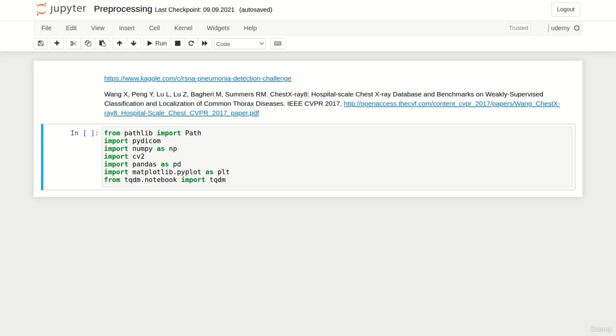Hi everybody and welcome to the first programming lecture of our Pneumonia-Classification project. In this lecture we will pre-process our dataset. You can obtain the complete dataset from Kaggle. Please take a look at the download instructions in the corresponding Jupyter notebook.